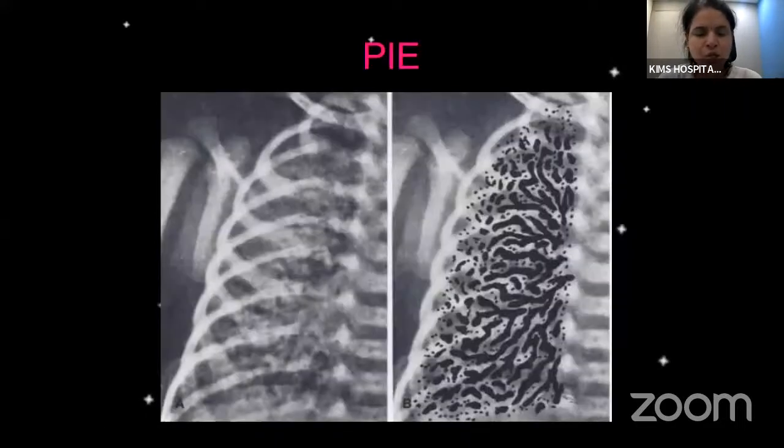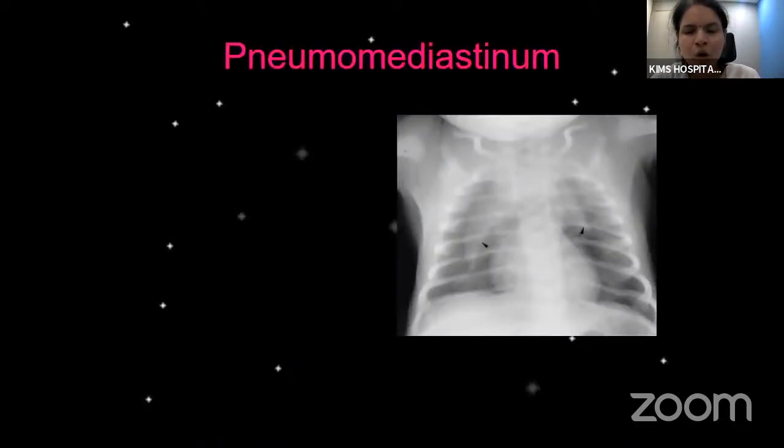So this is an indication of ventilator-induced lung injury, and this calls for reduction in the mean airway pressure, or we may consider using high-frequency oscillation if the baby is on relatively high pressures on conventional mode of ventilation. The other forms of air leak include pneumomediastinum.